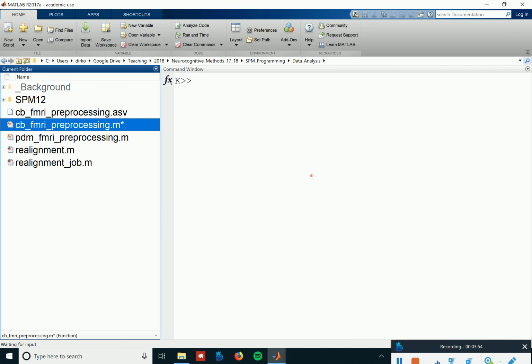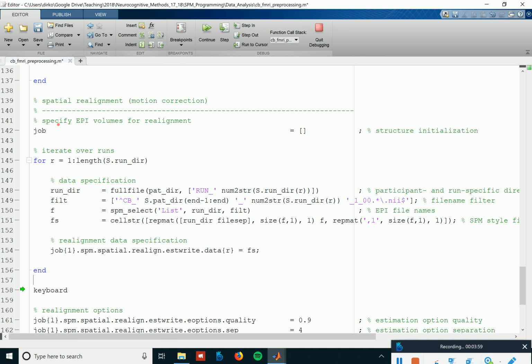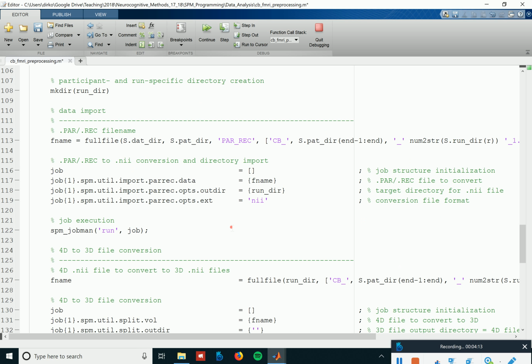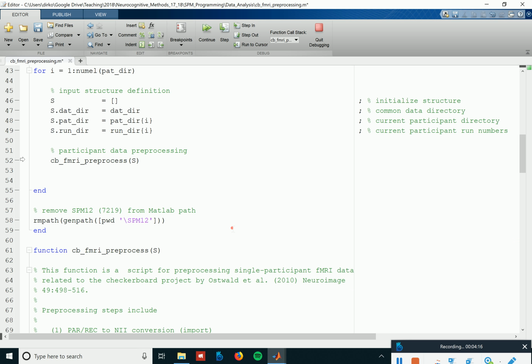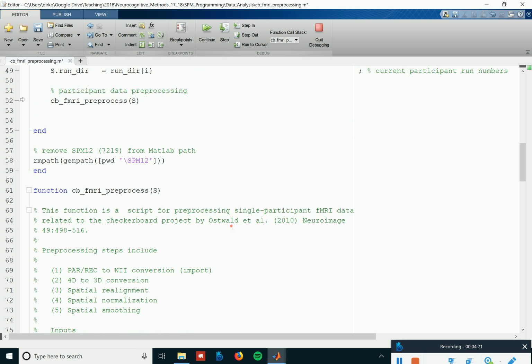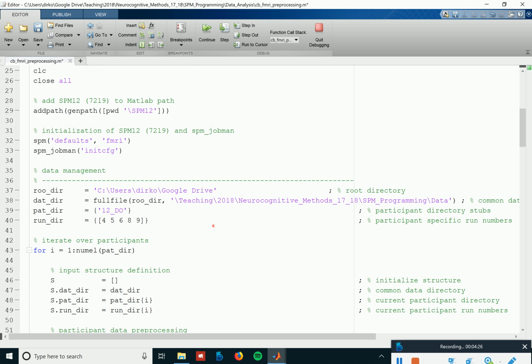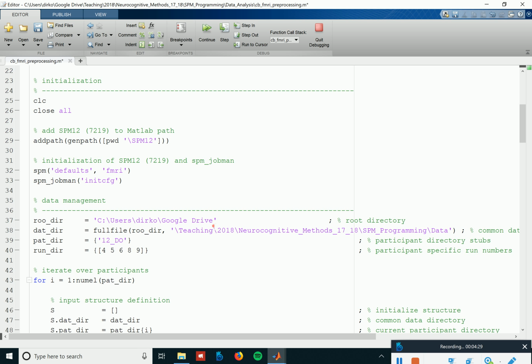Then we have, oops, that doesn't look good. Then nothing worked. Why didn't it work? It worked at home, but it's still not working. That's not good. Let's check what's going on there. So we might have to work further. At home it worked, but that might be still a directory issue. So let's have a look. Did any of you get this to work actually at home? No, you didn't. Try. Good.